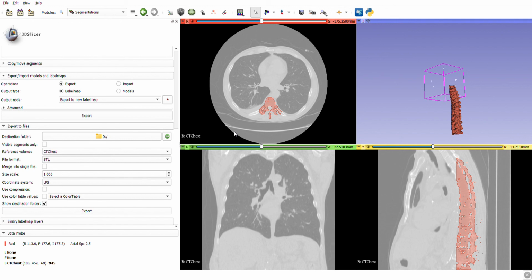If you are going for the FDM technology of 3D printing, that is fused deposition modeling, there is a software known as Ultimaker Cura. You can load this STL file, which we have got from over here, and carry out the further process. If you are going to 3D print this by using the technology of SLA, that is stereolithography apparatus, then we have a software known as Chitubox, which is a free software. You can load this 3D model into that software, and then carry out the process.